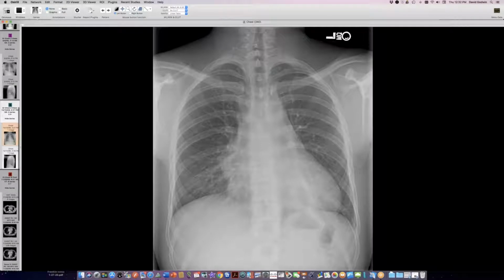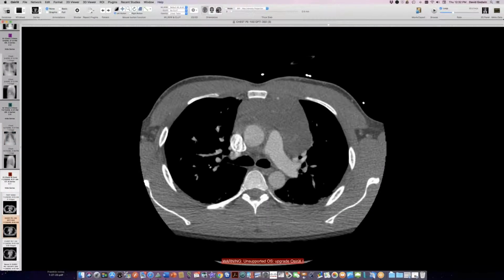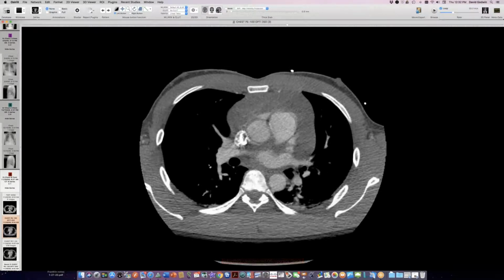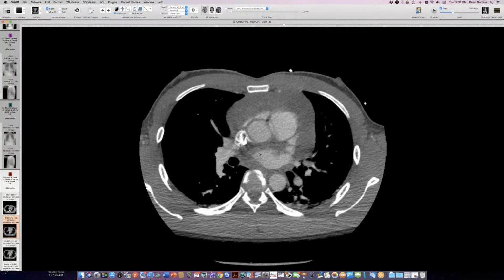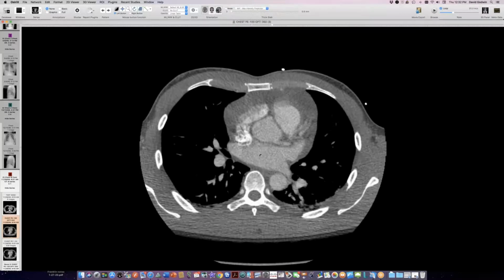Around this time, there was a CT scan, and it shows that there's this low attenuation mediastinal mass. I measured some density of this stuff, and it's about 18 Hounsfield units. So it's pretty low, but it's not fat. It's not a liposarcoma.